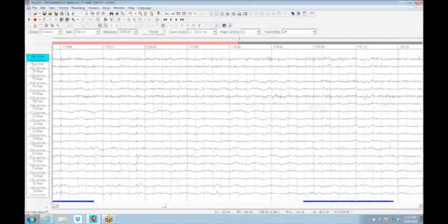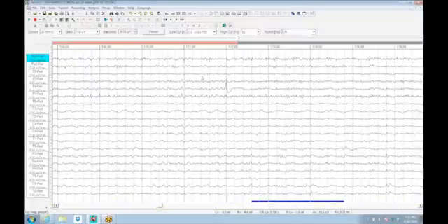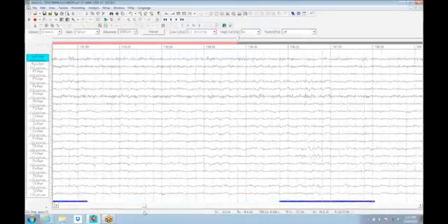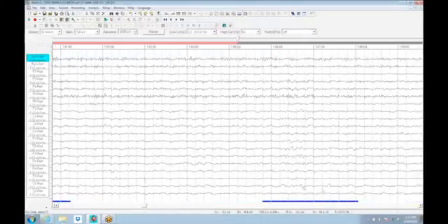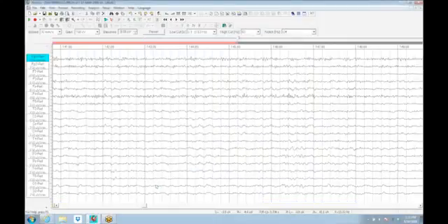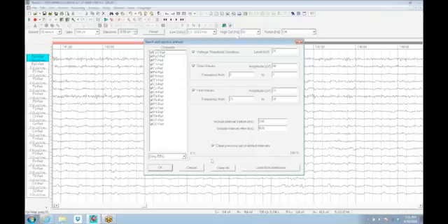So could you please show us then how you eliminate that removal of the artifact, essentially taking away the blue line? All of those blue lines, we now go back up to here, and we can either rerun this, which will keep the bad pieces that still meet that definition, but it eliminates when you have this window open.